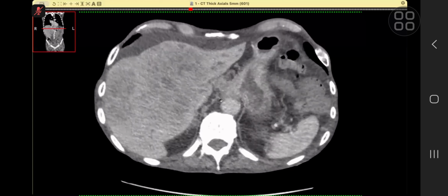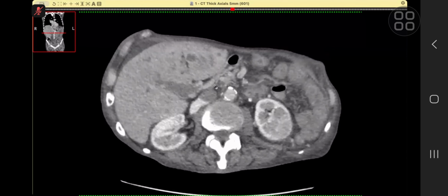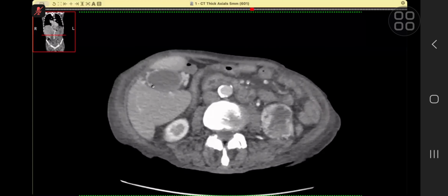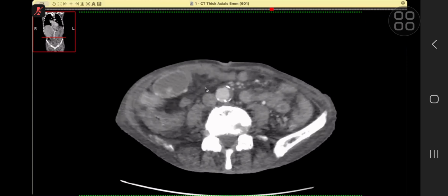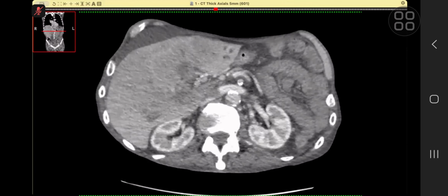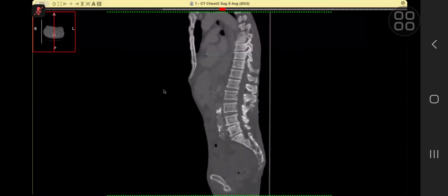So portal vein was well picked up, and maybe there is cavernous transformation here. You see all of this clutter of veins, and some of them are along the gallbladder also. You see this thing? So these are all cavernous transformation because of portal vein thrombosis. You did ask for the bone window. The patient also had diffuse bony metastasis.